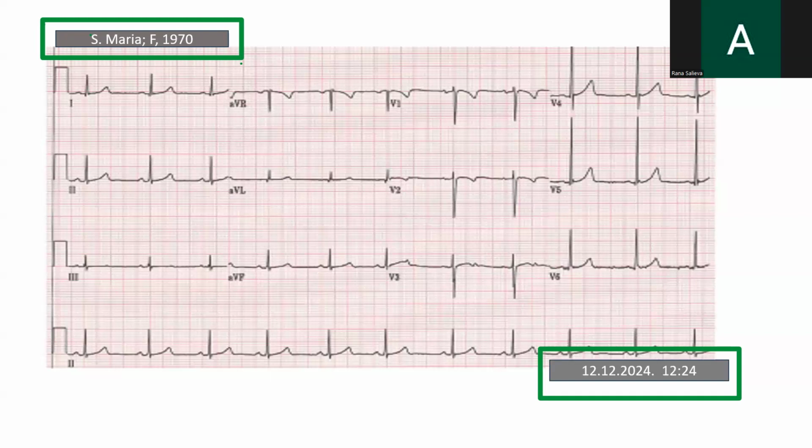Next, check the date and time of recording. This helps you decide whether you are looking at an acute event or comparing to a previous ECG for changes.